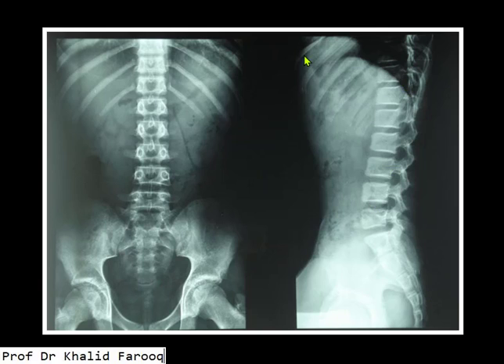Multiple ribs can be seen, and this is a psoas shadow. We can see a renal outline over here, this one on the right side and on the left side. We can trace ureters along the tip of the transverse processes, then at the level of the spine. Here we do not see any abnormal calcific density in renal, ureteric and bladder area.